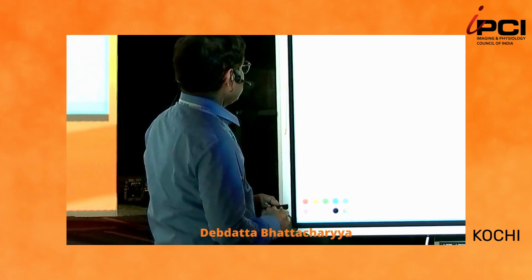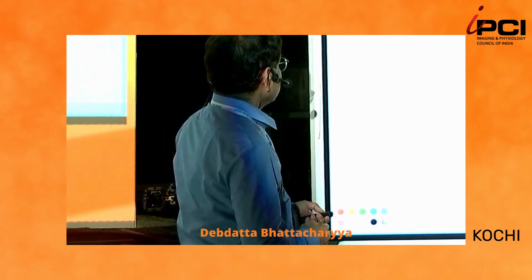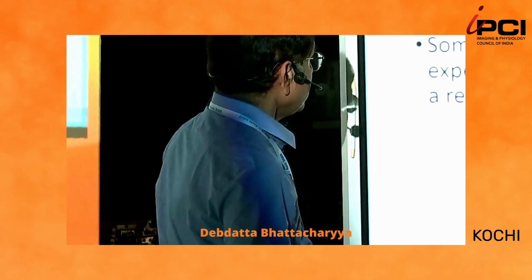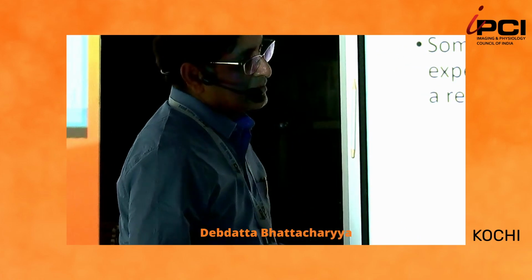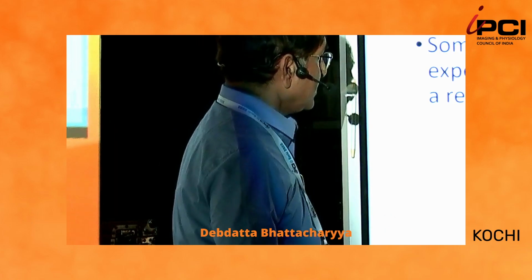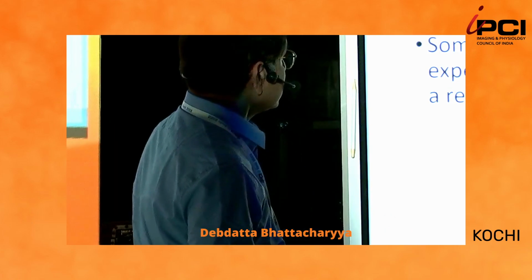What is the definition of an artifact? It is something observed in a scientific investigation or experiment that is not naturally present, but occurs as a result of the preparative or investigative procedure.